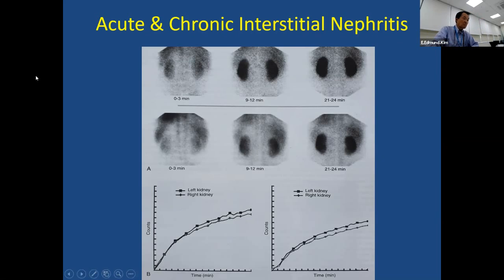The upper portion should be tilted toward the midline. If this is straight, and certainly a retroperitoneal mass lesion can deviate a certain axis. The renal axis should be like this, but there is some variation. But anyway, from here it builds up.